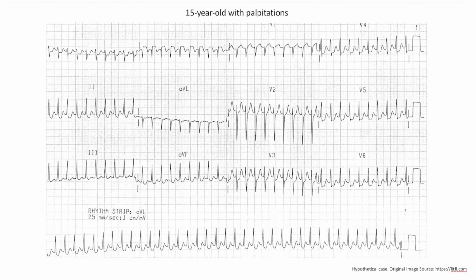Now, one thing to notice when the heart rate's very high, you notice these ST segment changes, and these may not always reflect underlying ischemia. So, a very high heart rate by itself can induce ST-T segment changes.